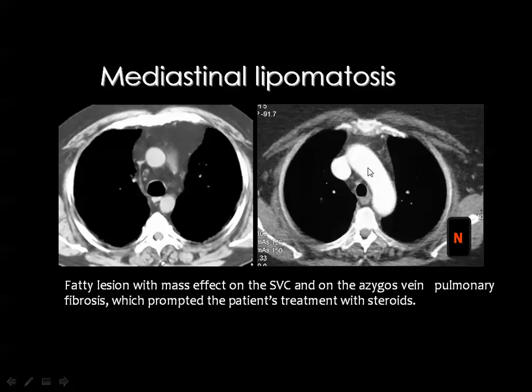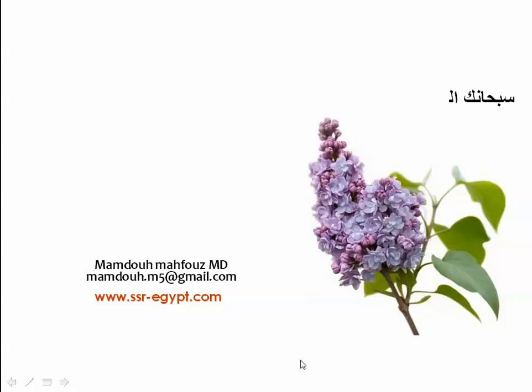You should accept some of the fat in the mediastinum, especially the anterior one, and also in obese patients. But whenever the fat is a little bit prominent, you may say that this is mediastinal lipomatosis, which is a benign lesion doing no harm for the patient.